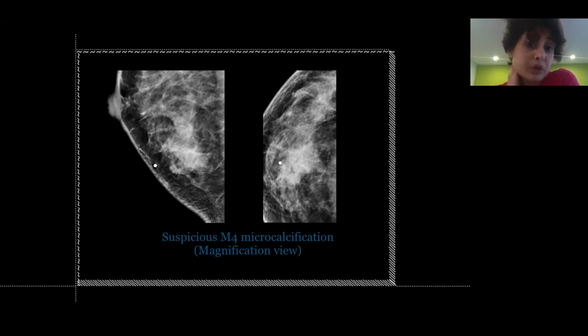And again, the grading on mammogram M4 is suspicious, bordering on, I think this is a cancer. So this is M4 microcalcification. Between M3 and M4, if you're struggling between an M3 and an M4, I wouldn't worry too much. It's fine to call things an M3 or an M4, because what you're essentially saying is, I am concerned enough about this for the patient to undergo a biopsy for this. And that is what has to come through. What is your management going to be on the basis of these numbers?